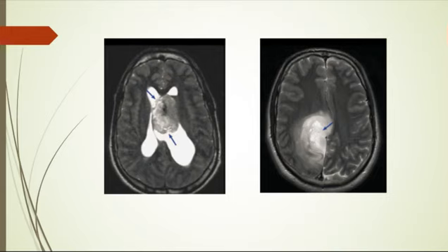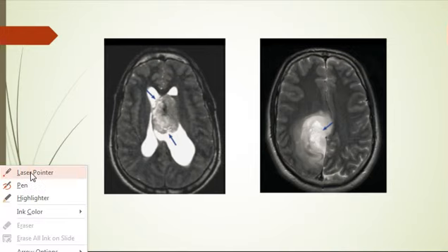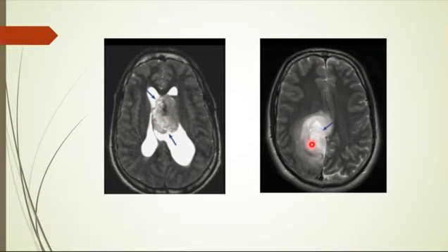No, not the diagnosis. What's the feature? The sign. The words we use to describe this are bubbly, feathery, soap bubble, Swiss cheese. All of these criteria you can use to describe this kind of mass. It can be like Swiss cheese, with multiple areas of hyperintensity, and you can see the bubbly, feathery appearance.